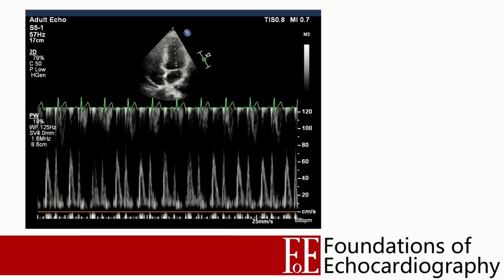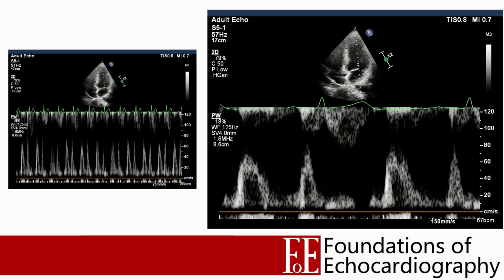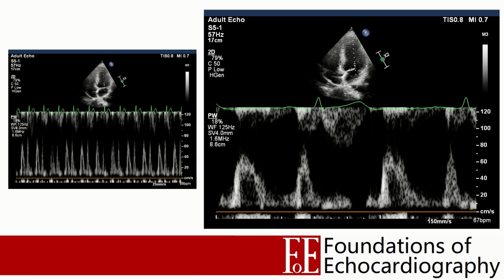In general, slow sweep speeds are reserved for when we wish to show variation over time, which is often variation with the respiratory cycle. The downside of slow sweep speeds is it makes accurate measurement of envelopes more difficult, and so when this is the priority, the sweep speed needs to be increased to show a few envelopes which can be measured much more easily.